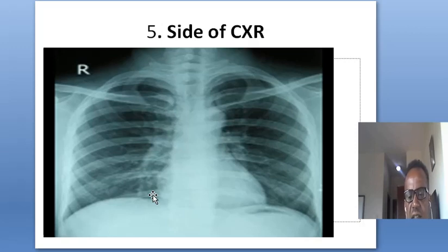And the third reason is that the left hemithorax is additionally occupied by the heart. So because of these 3 reasons, the right bronchus, the lung lobes, and the cardiac share of the left hemithorax, usually the right lung is greater than the left lung. When you compare the 2 lungs, here the right is wider than the left one.